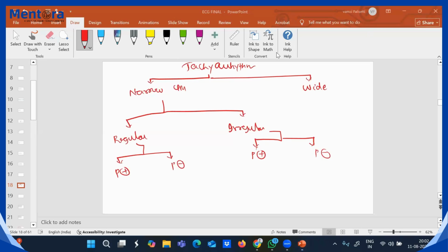Yeah. So this is what I'm saying. So you saw the ECG. In ECG, you're seeing some tachyarrhythmias there. First identify, don't panic, see the QRS complex. If it is narrow or wide. Narrow, it is supraventricular. Wide, it is ventricular. We'll deal with wide later. We'll come to narrow. It is supraventricular, identified. Then you see the regularity, whether it is regular or irregular. We'll come to regular, right? If it is regular, okay, it's regular only.